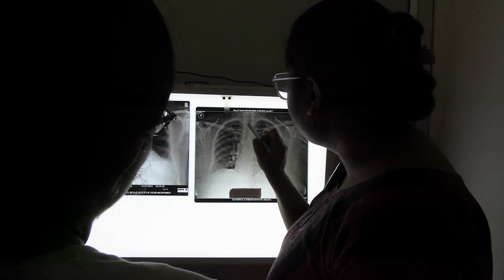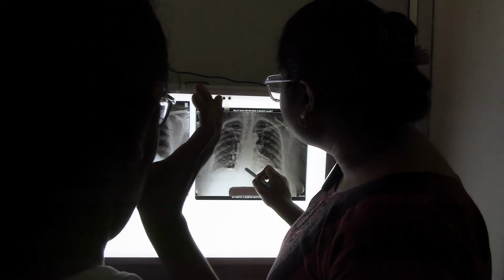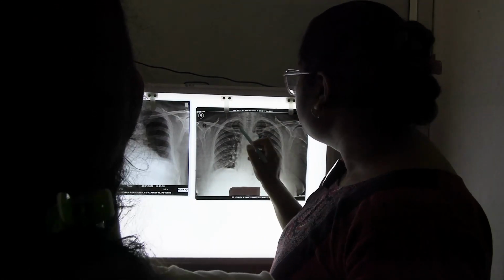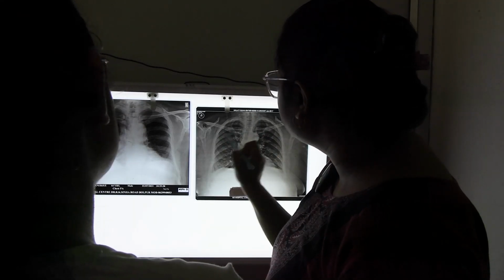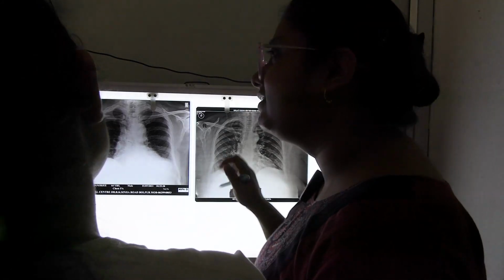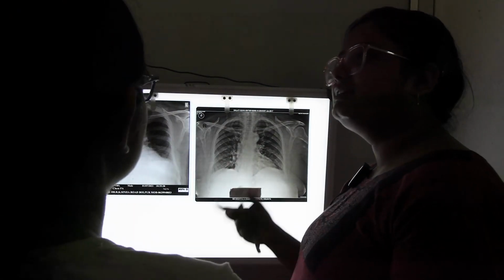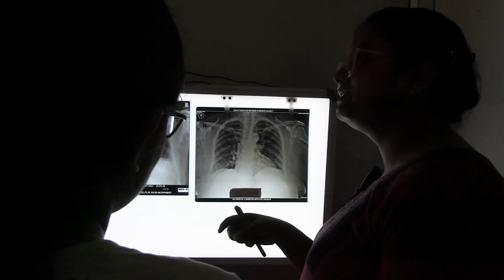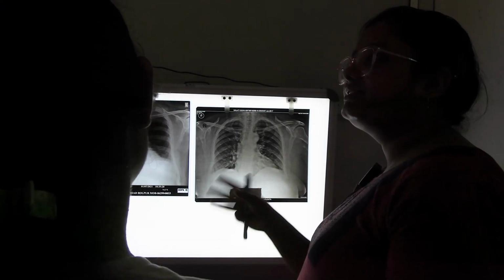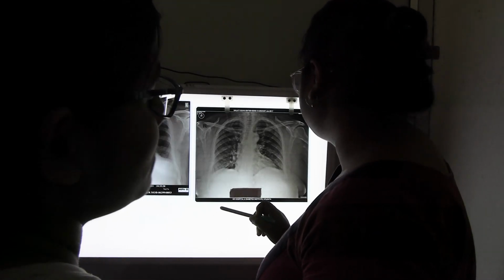Here is the cervical vertebra, and where it is joining with the first rib, from here is the thoracic vertebra. And in between the vertebral bodies, the black areas are the intervertebral discs. An intervertebral disc and related questions can also be given. By which structure it is formed, its development, all this can be given in your OSPE.